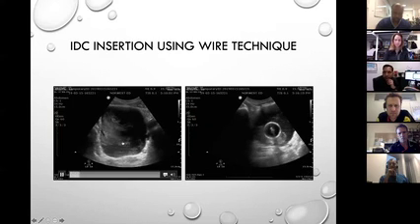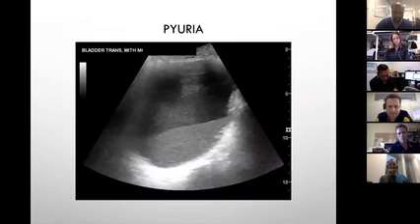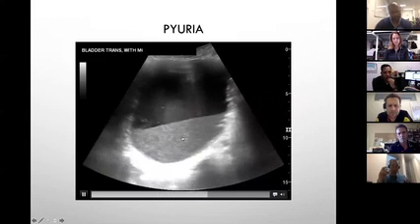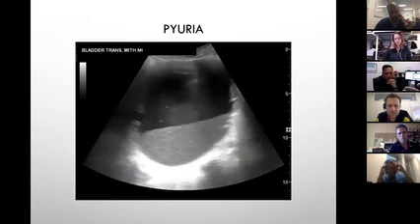All right, so that's actually a clot. You can see some kind of heterogeneity to it rather than a uniform, sand-like structure like in the pyurias. So that's a bit different, but it could be acute blood. I totally agree with Sam in that case. So it's not clotted, kind of thing.